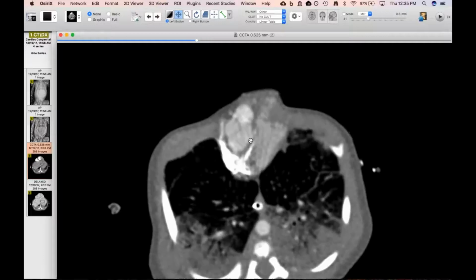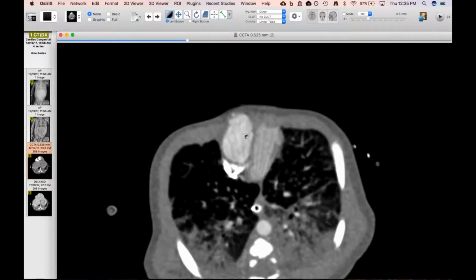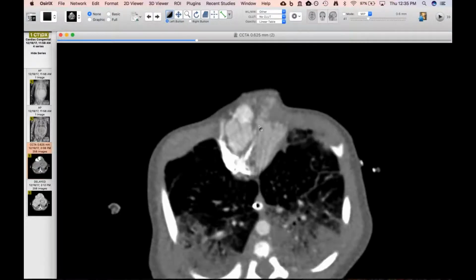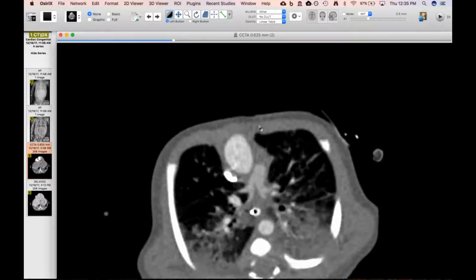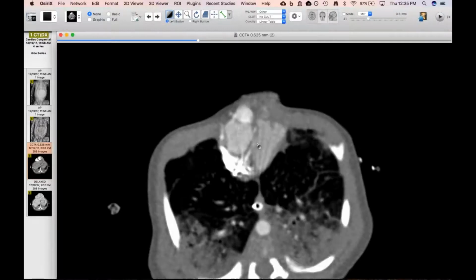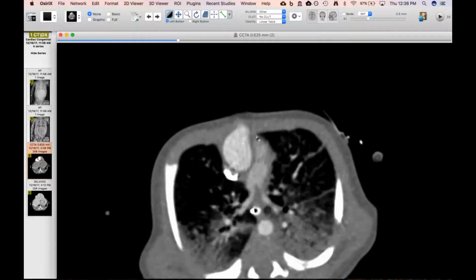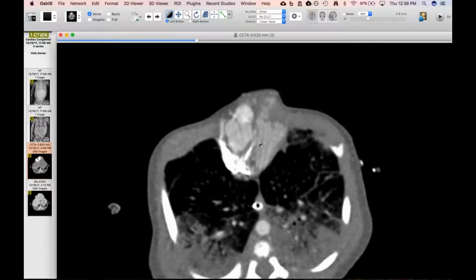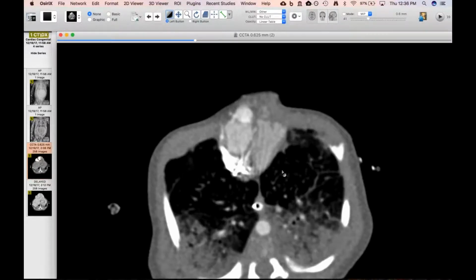This is kind of an interesting case because this is the aorta here. We know it's the aorta. You can see that the coronaries are coming off. And what's interesting, and I'll be curious what everybody's opinion is on this, is that the coronaries look like they're coming off of the cusps that they should be, like the right cusp and the left cusp. And the non-coronary cusp is more located posteriorly, as you would expect in a patient with a normal arterial relationship as opposed to transposition.